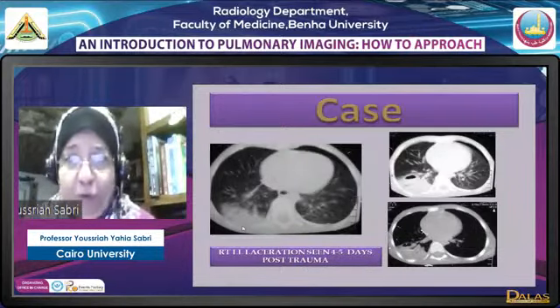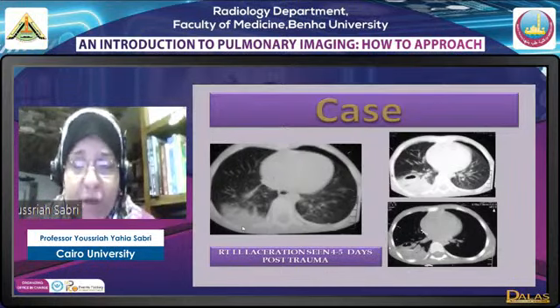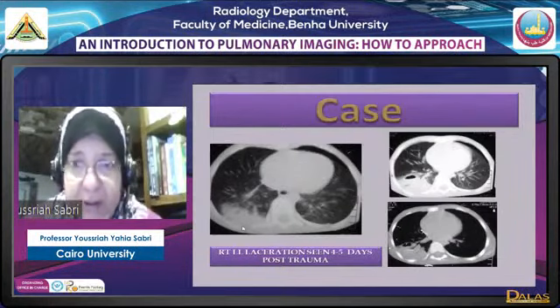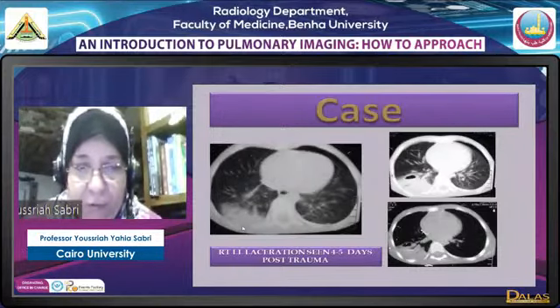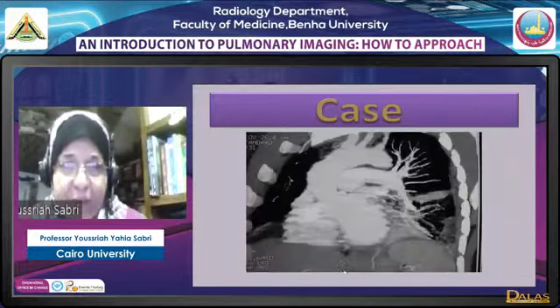Laceration will appear 4 to 5 days after trauma in the site of trauma, okay, and it will appear as a peripheral consolidation that shows cavitation within, and by time, as we have seen before, it will heal, leaving a cyst that will decrease in size by time. So a laceration is one of the appearances of unilateral peripheral consolidation.